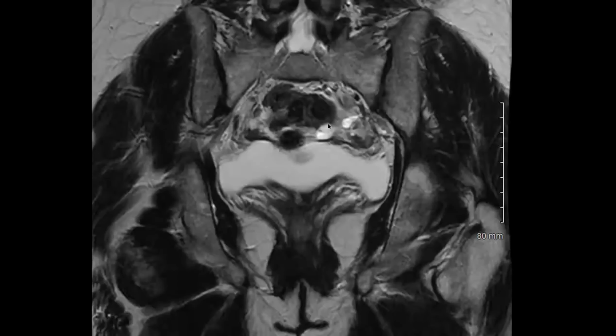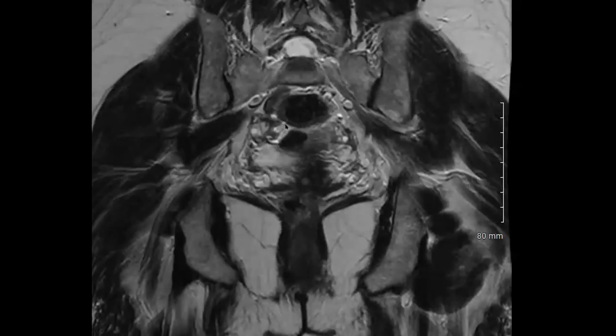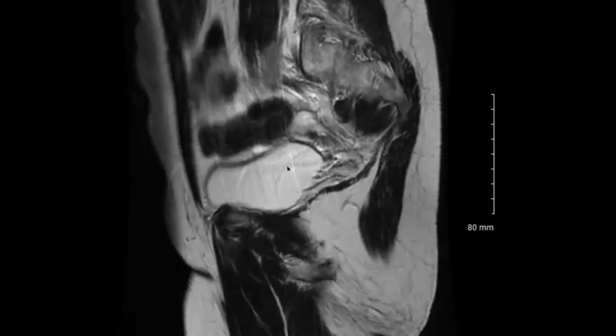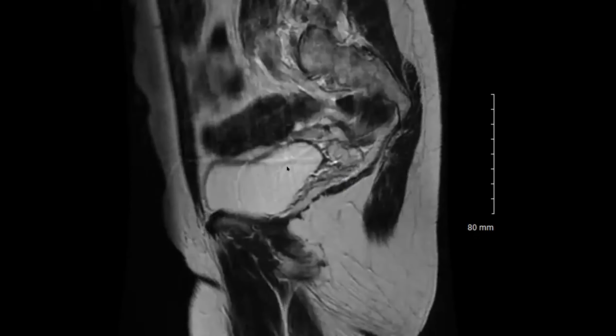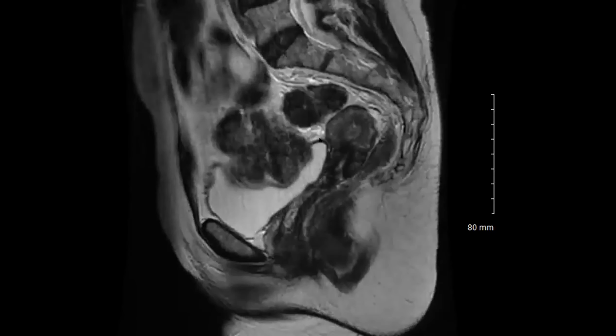What was interesting was there were some cystic structures like this. See this? Tiny T2 hyperintense. These are non-enhancing cysts on the surface of bowel loops. And then I went back. Like endosalpingiosis? Exactly. I didn't know that diagnosis at that time, but you know how the cookie jar has that case, and I pulled up that case as well for those who haven't seen this entity.